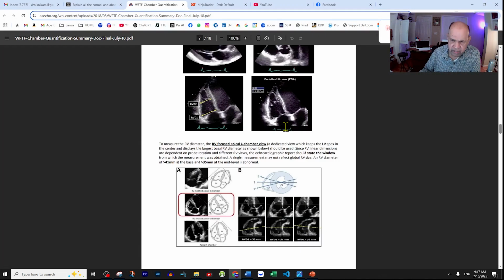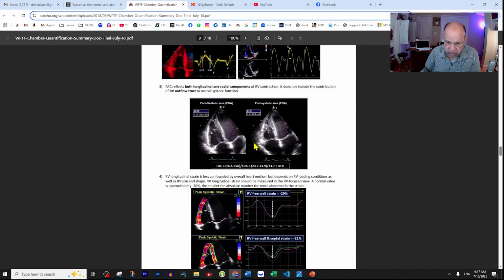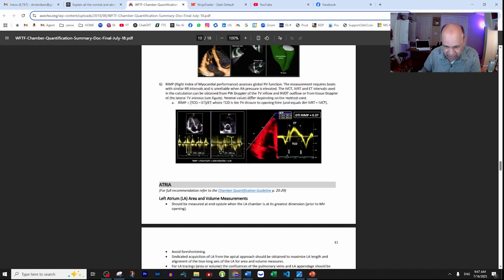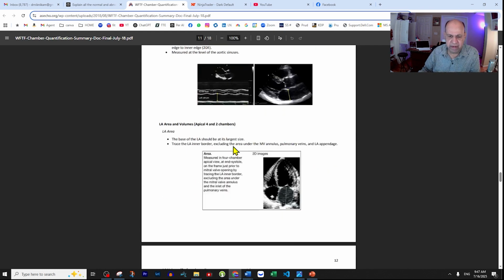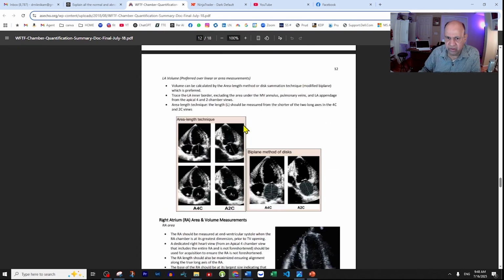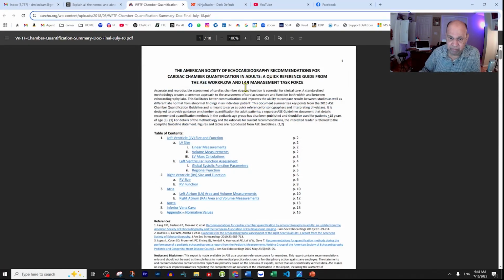So as you can see, you can build your knowledge exponentially rather than just looking at an image or getting one opinion, because look at all these different things that are covered. You can tangentially go and explore more by just posting an image or a video clip and then asking a series of questions that will give you the answer, and also references. So always remember, these references are real. This is from the American Society of Echocardiography, so you cannot undermine the reference here.